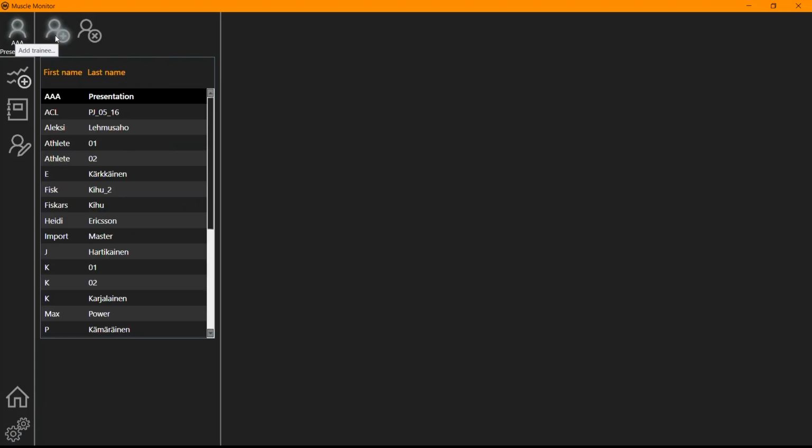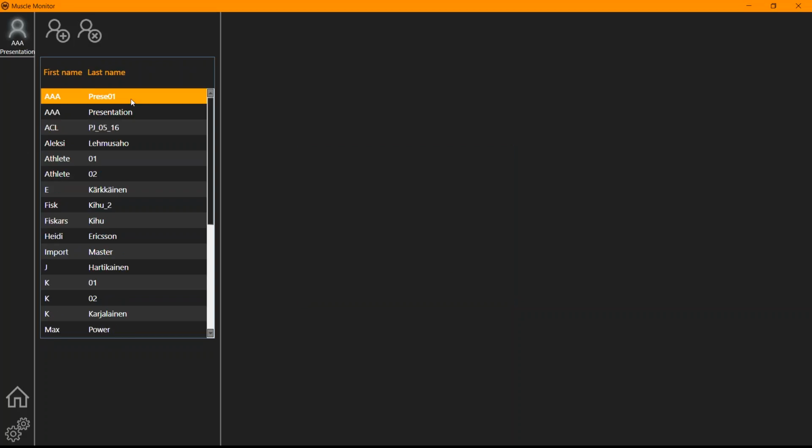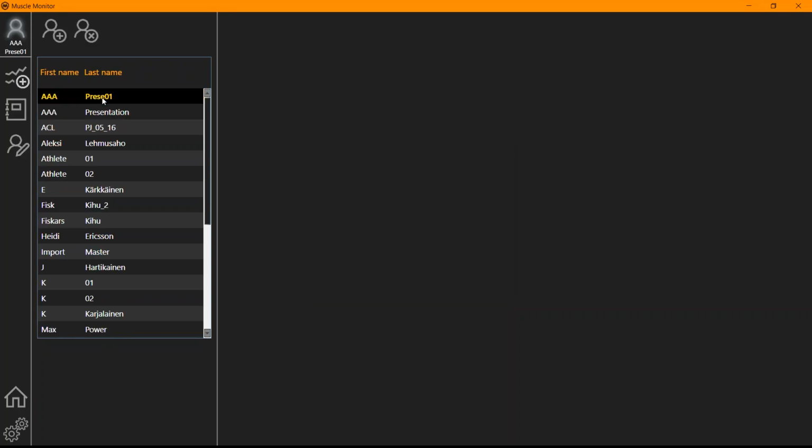So basically, from the top, we can add new trainees or delete previous ones. I already have some made, but we can make a new one for today's presentation. And it will be added to the list. It will only ask for a first and last name or ID or whatever you wanna call your trainees.